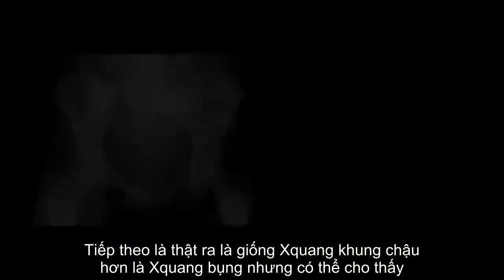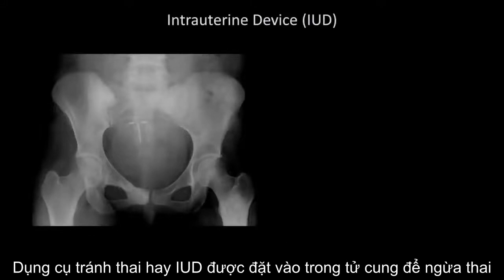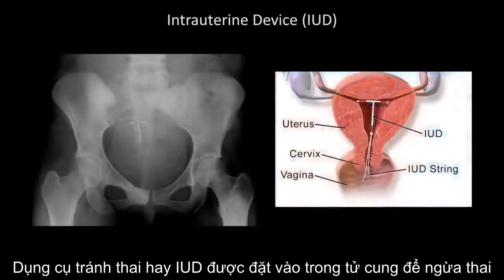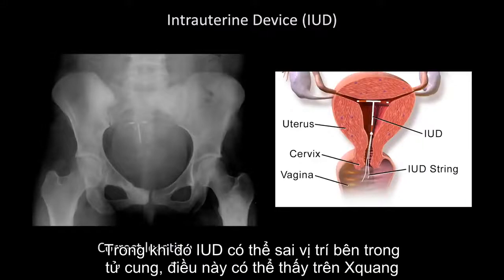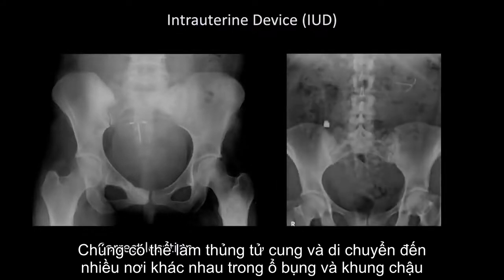This next one is actually a pelvic X-ray rather than an abdominal X-ray, but both can show this, an intrauterine device or IUD, which is inserted into the uterus as a means of contraception. This here is the correct location, in which it is oriented as an upright T, in the midline, and just inferior to the pelvic rim. While IUDs can be malpositioned within the uterus, which can be seen on X-ray, they can also perforate the uterus and migrate to various places within the abdomen and pelvis.